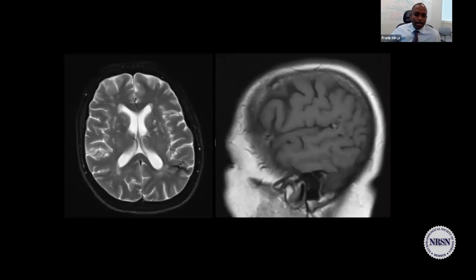Nevertheless, they go ahead and have an MRI. So MRI helps us. Whoa, we see a hemosiderin rim, and we have a little bit of bright central T2. What are you guys thinking? Let's get some guesses. What are we trying to describe here? Hemosiderin rim, bright central T2.